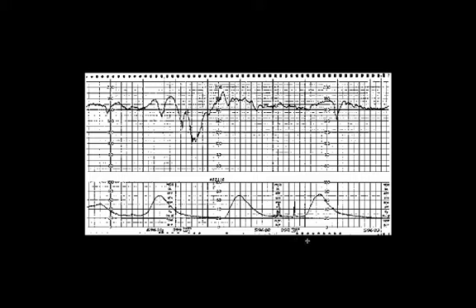And then from this contraction, we're not sure. It's 1 minute, 2 minutes, 3 minutes, and we don't know when the next contraction is going to start. So just from this strip, I would say that contractions are every 2.5 to 3+ minutes because we're not sure about the next contraction. Then we're going to do the duration of the contraction. So from the beginning of one contraction to the end of that same contraction. And here you'll see it's 20, 40, 60, 70 seconds. And then again 20, 40, 60, 70 seconds. So about 70 seconds.